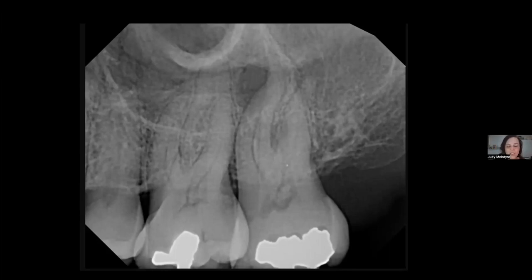To be very honest, depending on all of my other diagnostics, I would probably do this root canal, especially given all of my training. And possibly when I entered this tooth, I would have realized that something was different about this case, but that's why I rely on 3D imaging.